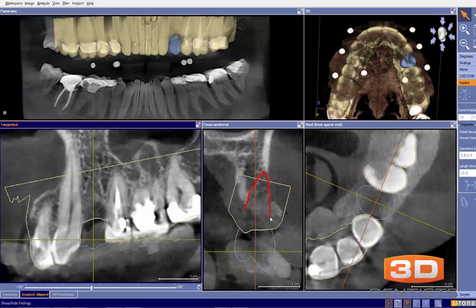form of that tooth. So my suggestion in this particular case would be to be ready to graft that area and just honestly lay a flap and see what's going on there. And then if we're going to graft that, we could add just a little bit of granules right there. So generally speaking, this case looks ready to go. In my office, relatively straightforward.